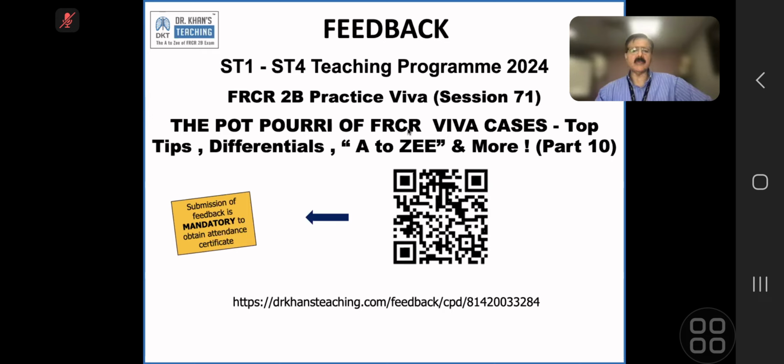So DWI is always useful as an adjunct, and tumors usually show restricted diffusion. But if the mucin inside is only mucin, then it will not show restriction. But when there are fronds of tumor inside, tumor cells inside, then it will show restriction.